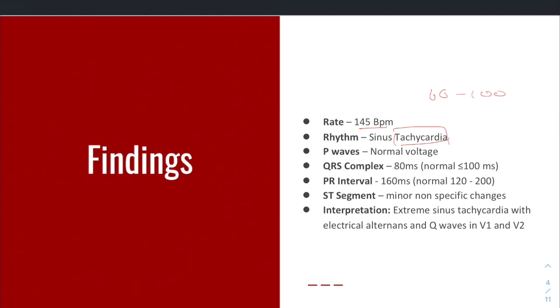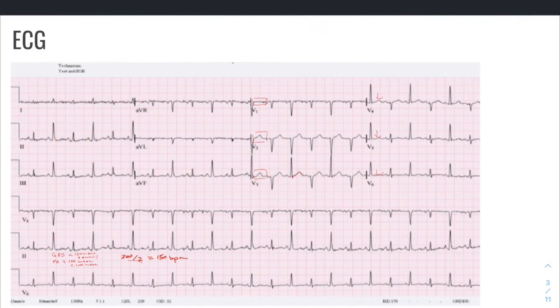So the question of the hour is, what is this ECG? I will just take you back here, and I think what to zoom in on is this alternating pattern of low QRS, tall QRS, low QRS, tall QRS, low QRS, tall QRS. And if you go back to your history, this is a woman who's been having non-specific chest pain, but was brought in with a BP of 90/60 and in sinus with a pulse of 130 and with jugular venous distension. So all of those together paint a picture of what our case this week is.